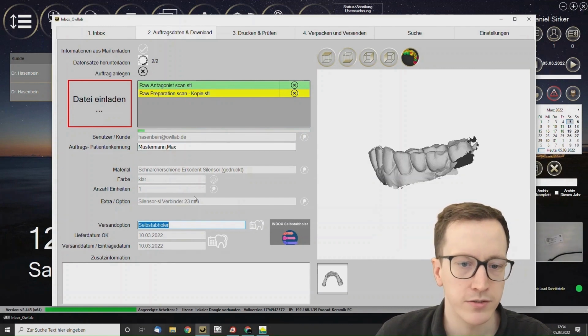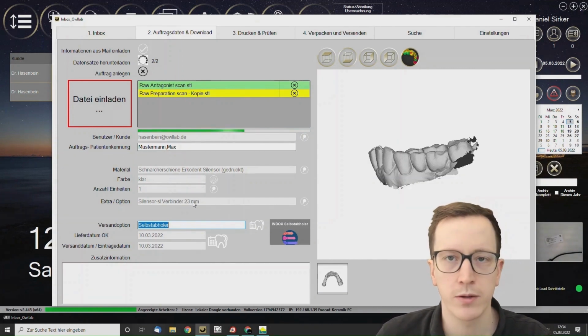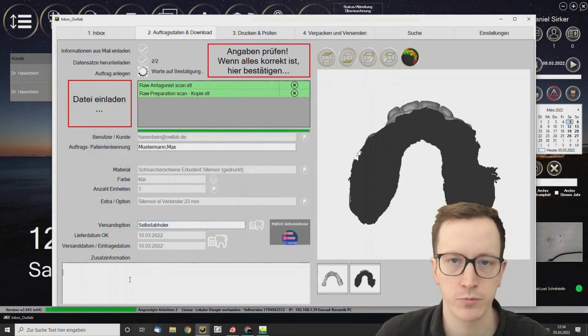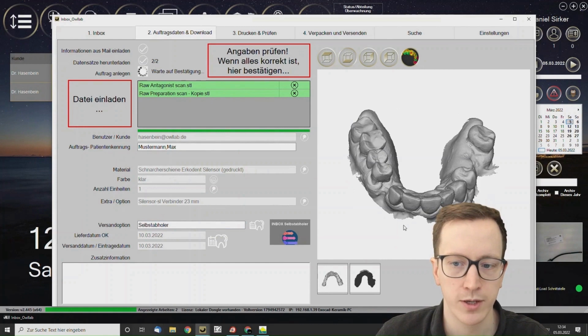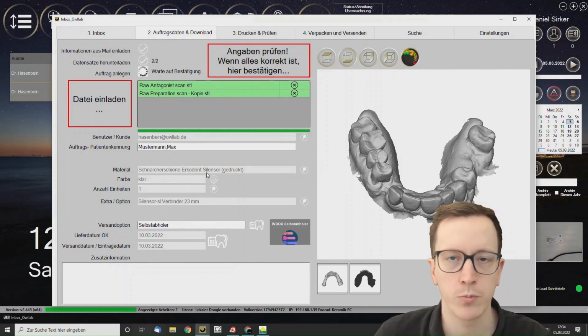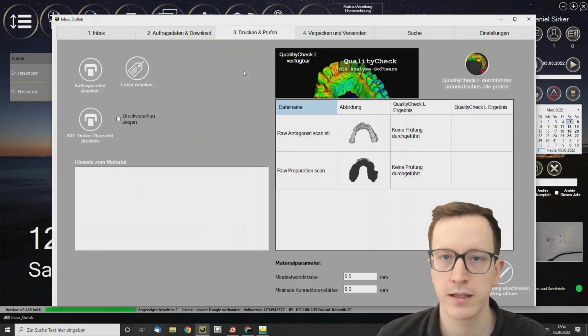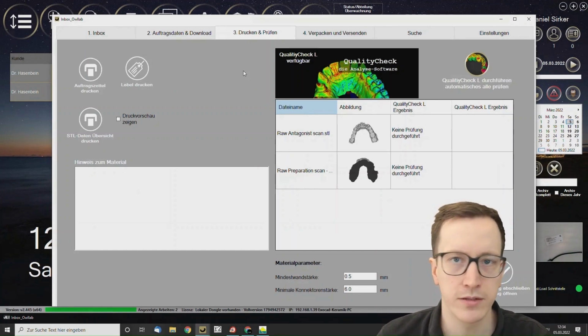On the left side, I can see the complete order that was sent to me by the customer, with all the info he shared. Extra details have been filled out, and now I am able to make corrections to the entire thing. But essentially everything has been completed, and that is all for the present time. Can I confirm up here then? Whatever happens at this moment, I have already deposited a bill in the material selection of the snoring splint. That means theoretically even the billing would already be done in the background at this moment.